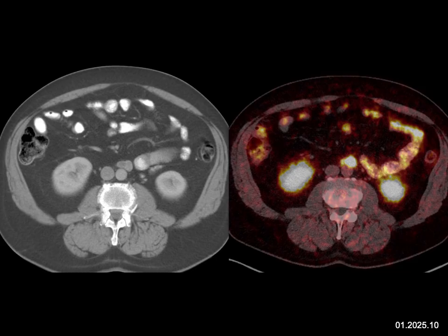Castleman's disease, usually hypervascular, not quite periaortic region, more in the mesentery. But you know, Castleman's can be anywhere. Their size, 2 to 5 centimeters, usually solitary, but can be multiple, but they're usually not so bright on PET scan.